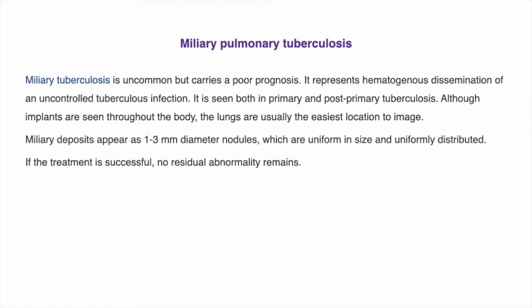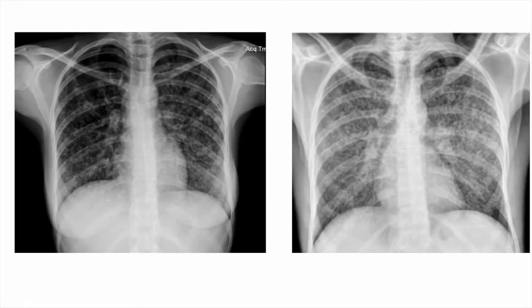Remember, this is a pattern of multiple and bilateral micronodular lesions, like this one, from 1 to 3 millimeters, uniformly distributed. It's a classic image. We have another 4 or 5 differentials for this one, but it's not the main focus of this tutorial. Now remember, you need to take into consideration the history of the patient and the lab tests, in this case, to confirm your final diagnosis. That's very important to know.